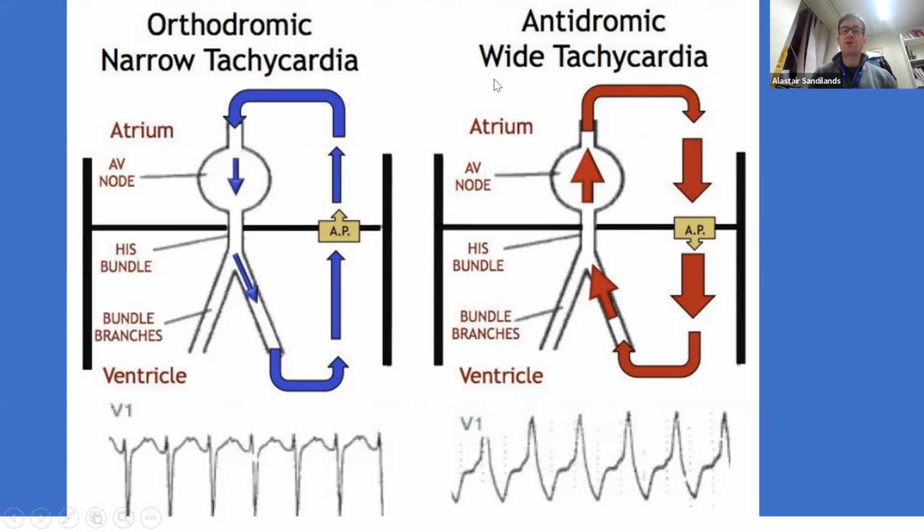So we'll go through broad tachycardias next week. But again, just trying to show you why in Wolff-Parkinson-White with an accessory pathway you can get narrow complex tachycardia and also broad complex tachycardia. It's by virtue of the delta wave. It's by virtue of where the tachycardia is traveling.